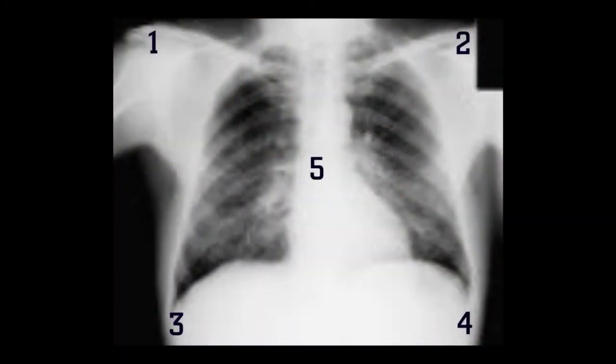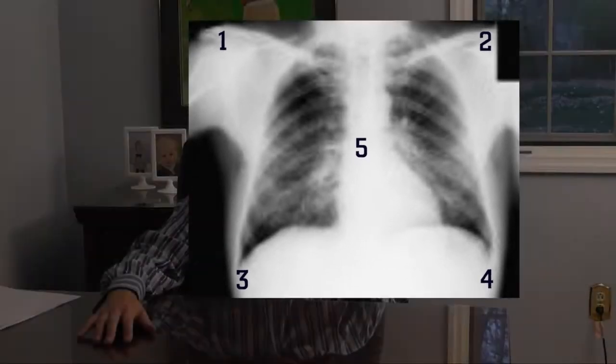So we are looking here at a chest x-ray. I want you all to take a couple of seconds here and look at this image. I'll give you a few seconds and then we'll talk about it. All right, so pretty clear cut. What do you think?